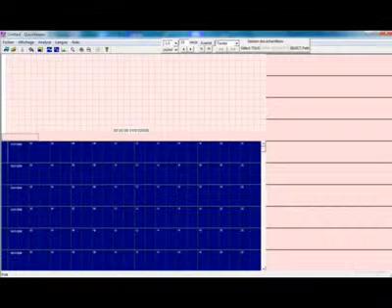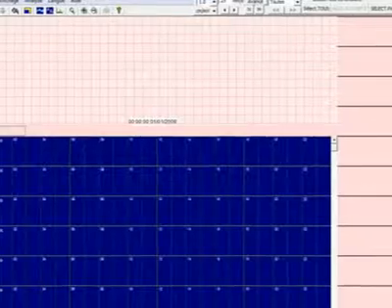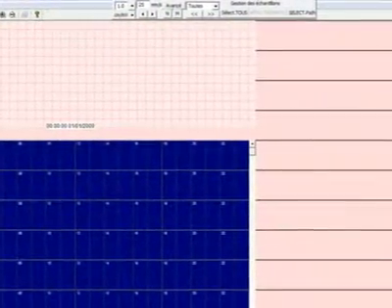Quick Reader provides a very comprehensive working screen. The layout and content have been studied to avoid possible spread across multiple screens. You will be more familiar with this program once we go through the tutorial.